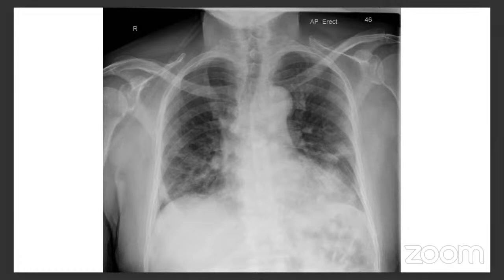This was an X-ray on presentation. And if you look at it, you can see bilateral patchy infiltrates in the mid-zone with some loss of definition of the diaphragm. They are bilateral, they don't have any lobar distribution. But anyway, he was brought down to my unit and it was found that his oxygen demands were increasing, as was his shortness of breath. So within a few hours, he became very unwell. Next slide, please.